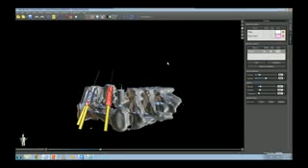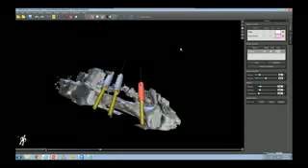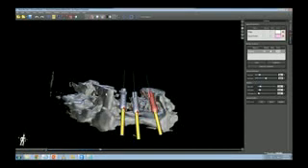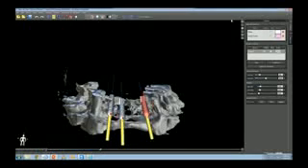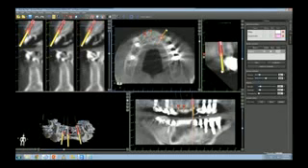And also by adjusting the density threshold, you can get a sense of the relationship between the root and this implant, and the number 7 implant and this cuspid. So that's using a flipper for future tooth position.